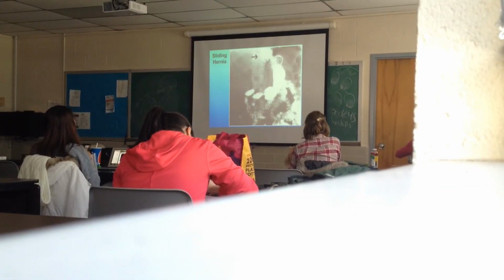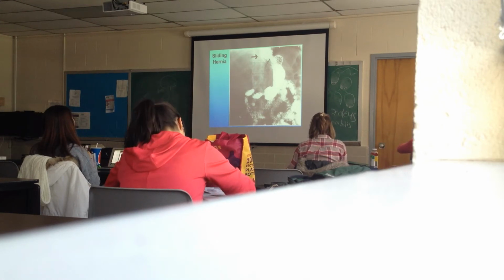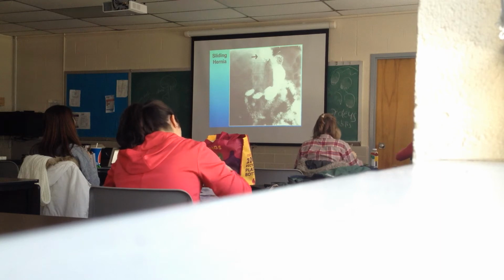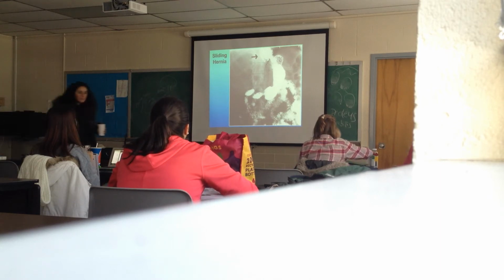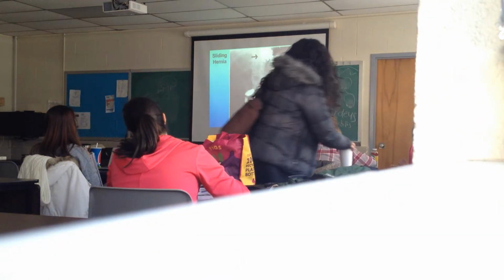You should be able to recognize the radiographic findings associated with hiatal hernias. For example, a sliding or axial type hiatal hernia. You notice part of the stomach is just above the diaphragm right there. You should be able to identify the other parts of the stomach. Okay, here's the corpus, antrum, bulb, and you can see the bottom of the stomach.